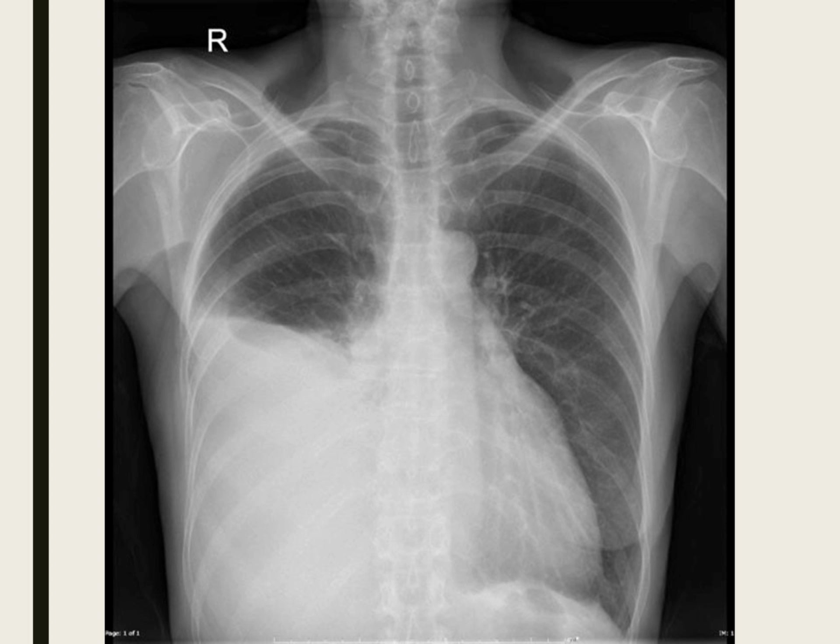Is there any rotation on it? So the distance from the clavicle to the middle here is about this far, so no rotation, looking good. So, you're happy with the quality of the film, right? So now the airway looks what? Good, midline, carina is about here, right main stem, left main stem bronchus. I like it.